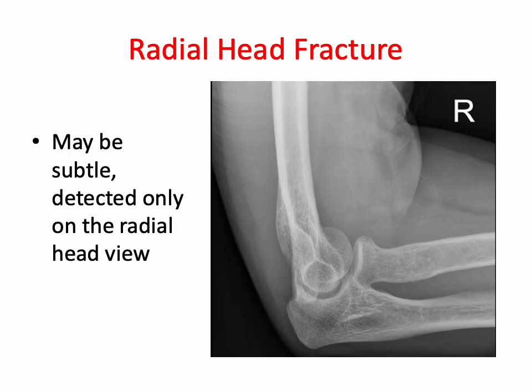Radial head fractures may be subtle. We can do dedicated radial head views to see these fractures, and we can see here there's a subtle cortical step just there.